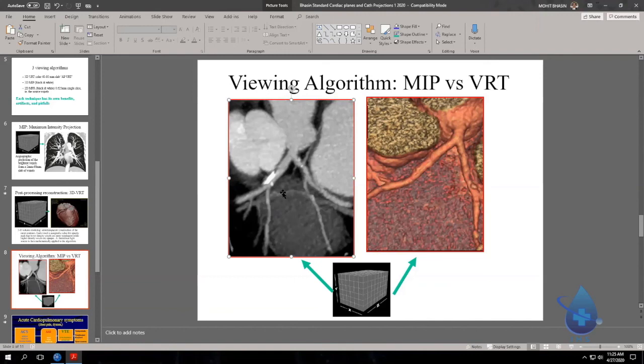Now, what's this vessel? Anterior interventricular vein. Yes. Anterior interventricular vein, okay? It courses with the anterior interventricular artery, which is the LAD. Now the AIV, as it comes across here, it will change direction 90 degrees and enter the left AV groove along the circumflex, and that's where we give it a new name. What do you call it? Great cardiac vein.